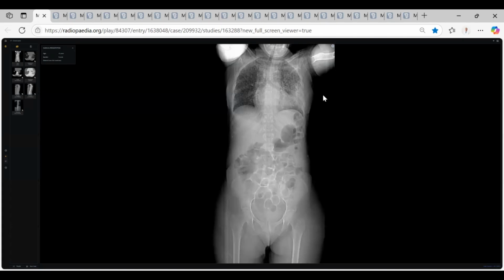No, sir. Otherwise, bilateral lungs have some granular, reticular opacities noted in both lungs, especially more on the left upper zone also. Okay, this is something more than granularity. This appears to be reticular with some possible small cystic areas within it.